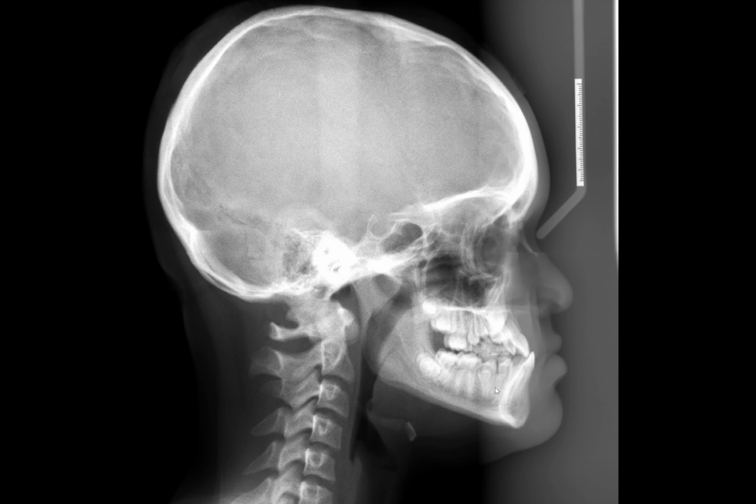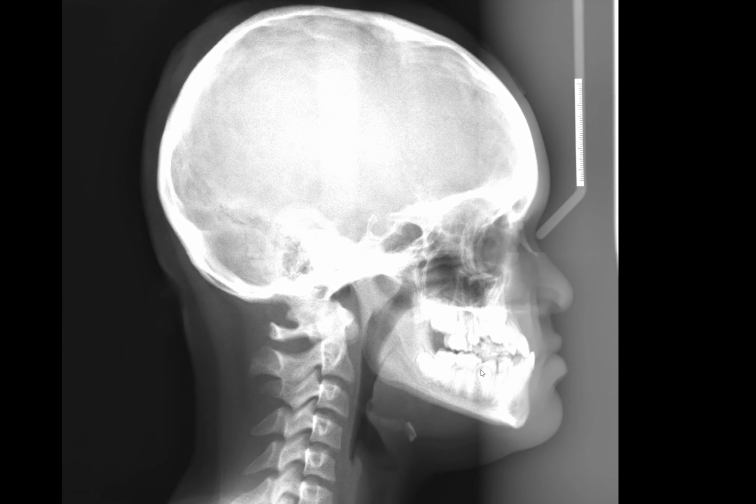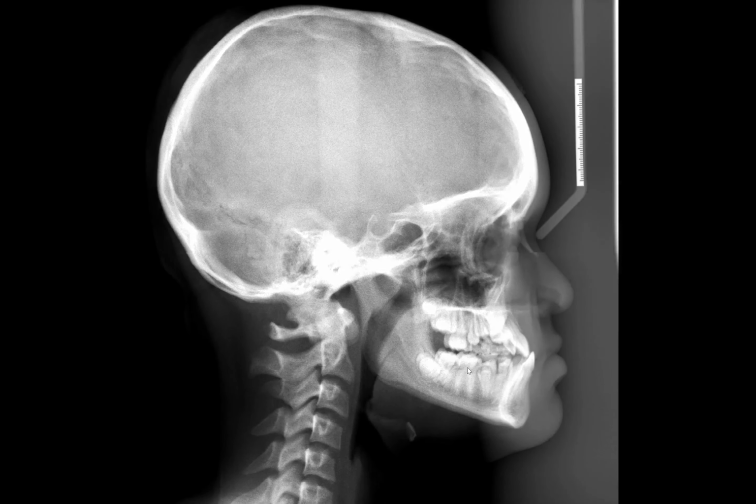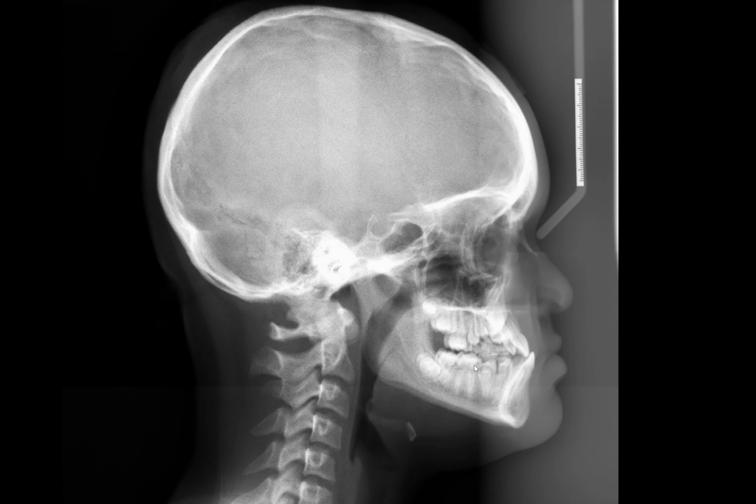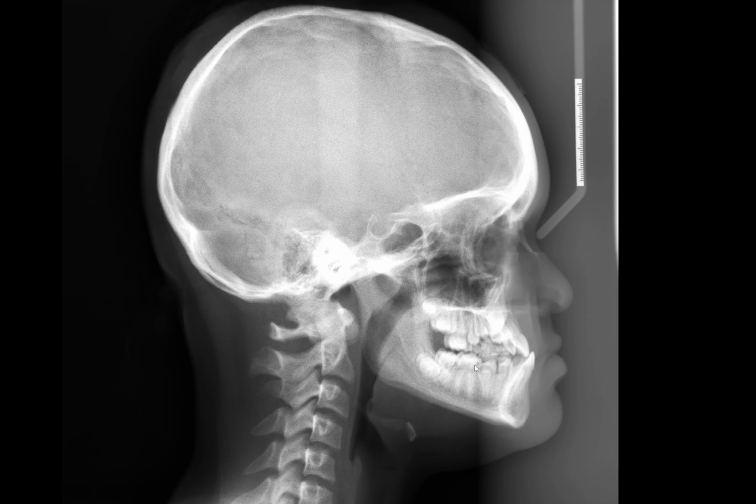So let me try to change the contrast. Okay, I think this is a good contrast to address my point. I don't know, I hope you can see this. There is a faint line down the image, and anything in front of that area, the soft tissue outline, is a lot more visible and clear.